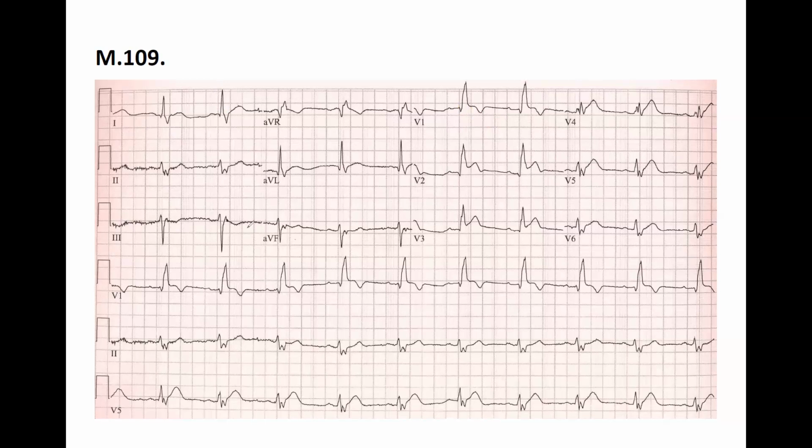Which one? The right. Because you see that the ventricular activation time is elongated, or you see a wide R wave in V1 and a wide S wave in lead 1, or you can go for V5 or V6. It means that's a right bundle branch block, a complete right bundle branch block. So far it's okay, let's continue.